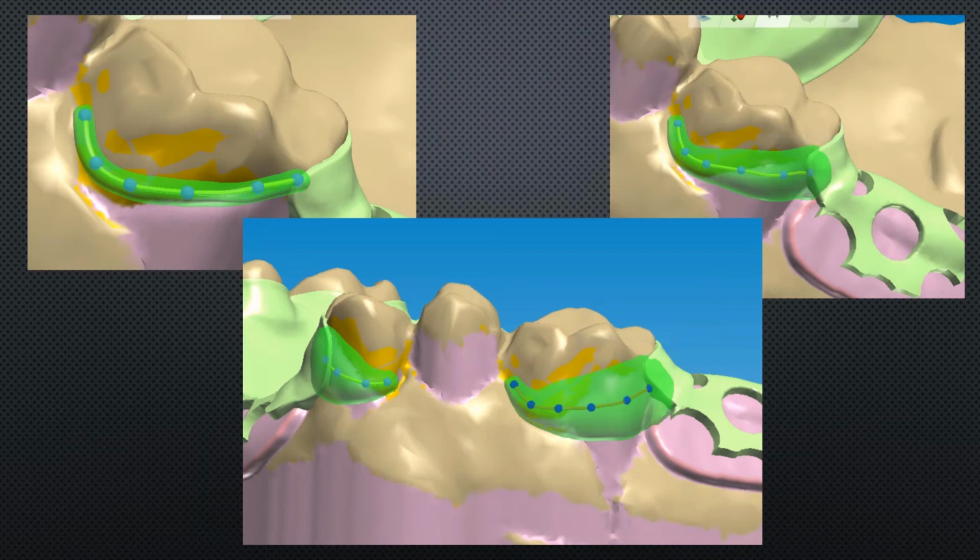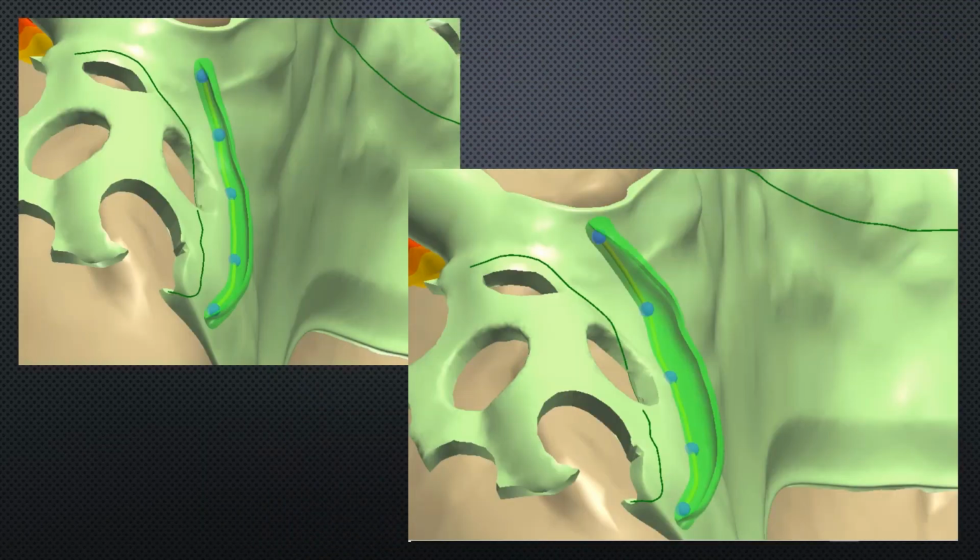Make them a little bit fatter, and you can make them a little less broad. And there's not a right way or a wrong way with either one of those designs necessarily. It is nice that it wouldn't touch the tissue, but it may be just a little fatter and just a little bit more of something on the tooth when they smile. So that's really something that can be kind of up to your own philosophy but like I said, make everything a little bit heavier and then kind of contour and shape until you dial it in, and then digitally you'll be able to have them come right out of the mill, snip them out, clean them up, polish them, and they're ready to go for a frame try-in.